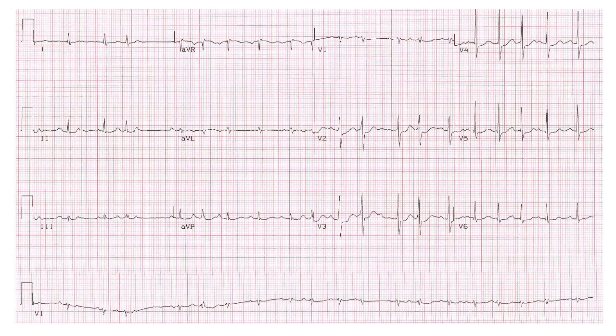So now I'm going to start looking for discrete P waves. Can I find discrete P waves? And again, in lead V1, it's kind of tough to see. I can see P waves, but they're not as easy to see as in the precordial leads, particularly lead V3, and I think 4 and 5, where I can see P waves more easily.